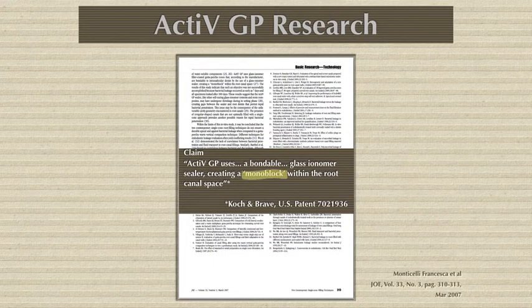And according to the manufacturer's instructions, it states clearly that you prepare, for example, to the size 25/06. And then what you need to do is to get a laser-matched Gutta-percha to that particular file, which is coated with this glass ionomer cement. You will put glass ionomer cement inside the canal. Please don't believe a word I say.